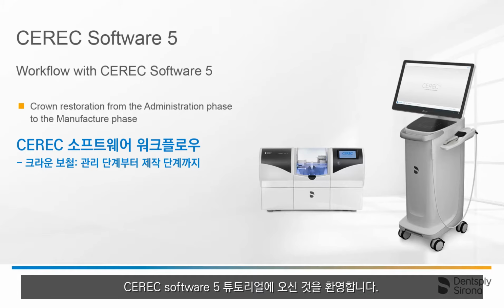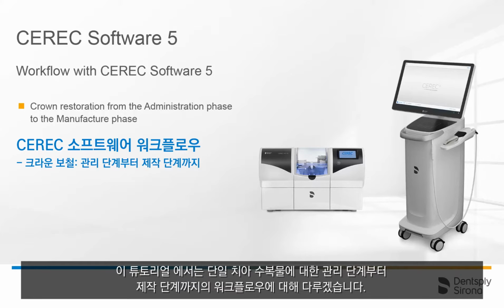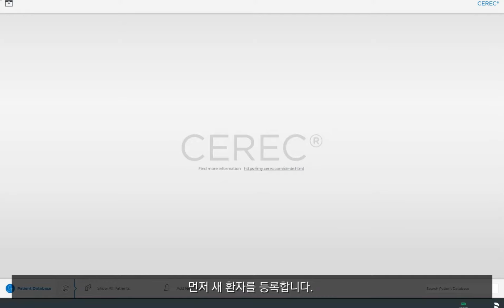Welcome to this video tutorial on the topic of workflow with Cerec Software 5. In this tutorial, we will demonstrate the workflow from the administration phase to the manufacture phase in the case of a single tooth restoration. First of all, we set up a new patient.